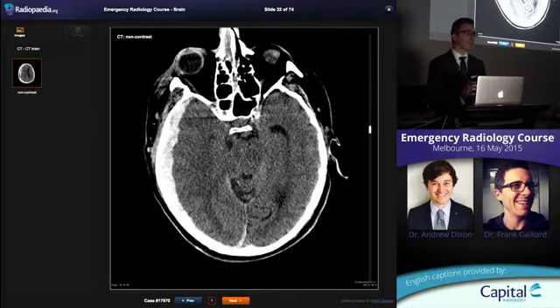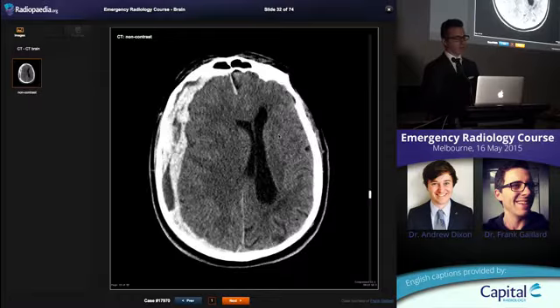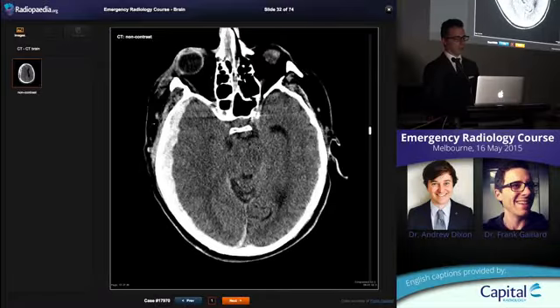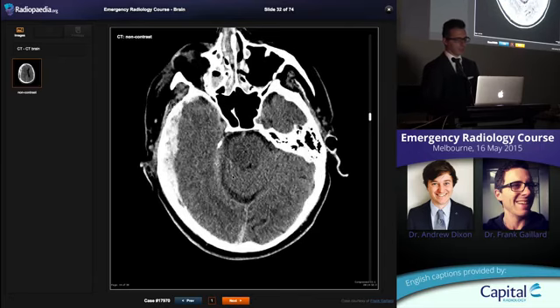The best place to look for hydrocephalus is the temporal horns. They will be the first ones to go up. You need to get an eye in to know what's an appropriately sized temporal horn for that age group. But here they've got a degree of compression from hydrocephalus and therefore downward herniation. Note that the uncus, the medial part of that temporal lobe, is filling that recess and deforming the midbrain. It's really hard to see even where the CSF is.